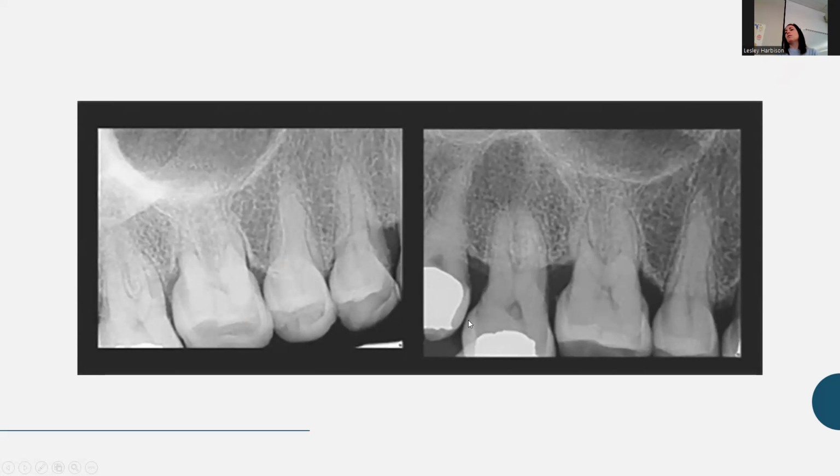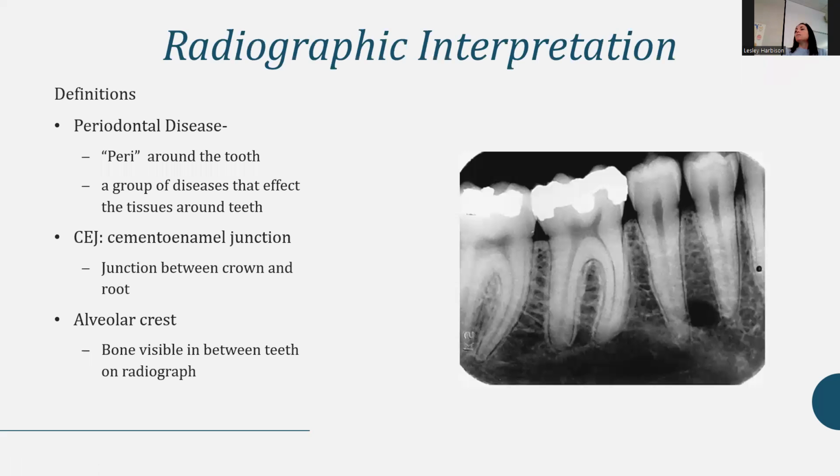I don't know if these are even the same. There's fillings here that this one doesn't have. Oh no, yeah, it is the same image. There's that filling on this tooth. This one's just more anterior, this one's more posterior, but they're the same teeth, or the same side of the mouth, I should say. So that's probably a question: parallel technique is the most ideal for checking bone level.